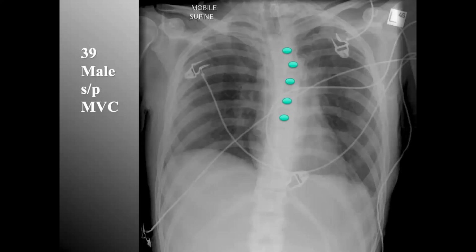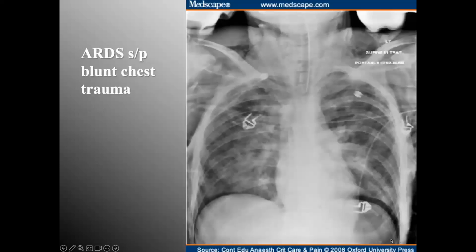You can see the paraspinal hematoma as a bilateral posterior mediastinal shadow. That's what you're seeing here. This is not the aortic knob. You're silhouetting with that hematoma. Not that you have to know this. This is kind of a one-off, but I wanted to get the pump prime to start things out.